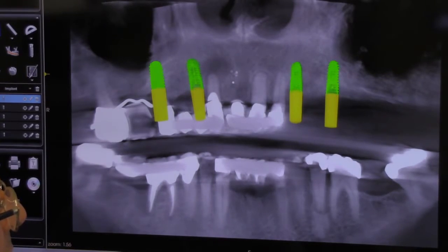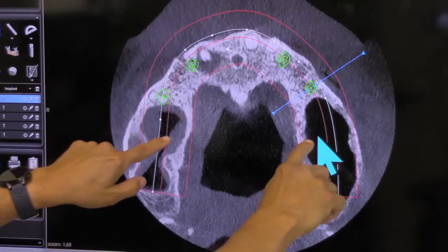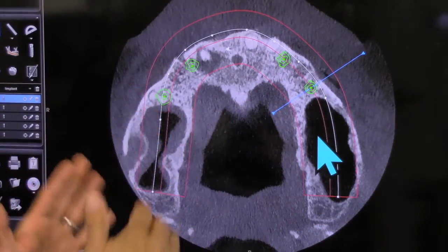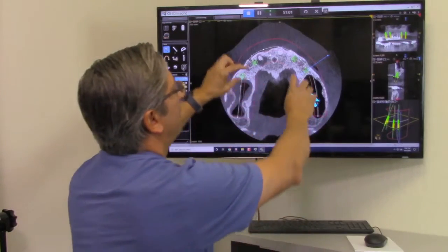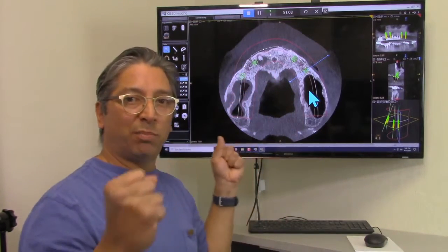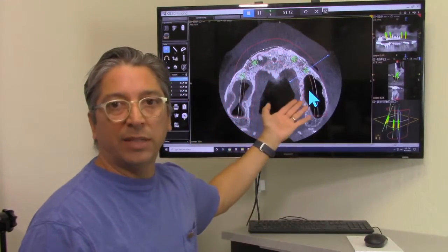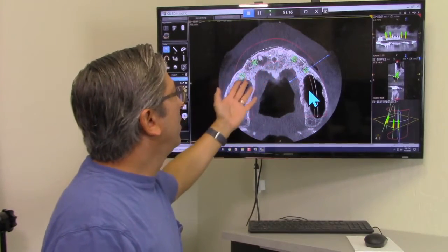We'll get a decent stability factor when we take our denture out to the first molar position. If we wanted to increase the stability of that denture later on, we have a nice foundation of those 4. We can add over bars that then have the locator attachments split further away. If you were to do a fixed piece, a hybrid piece, this would be an appropriate spread.